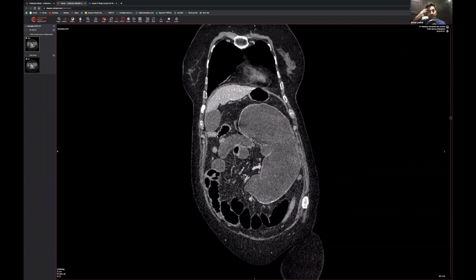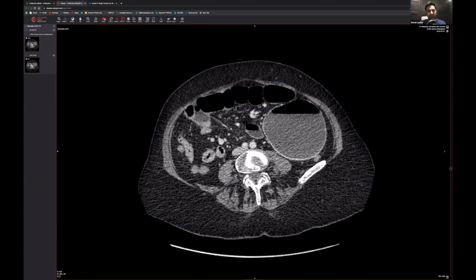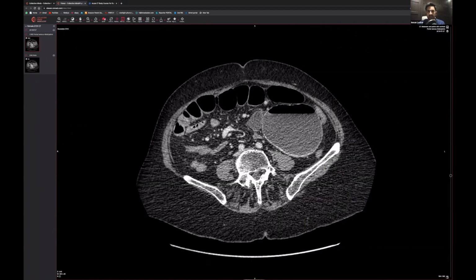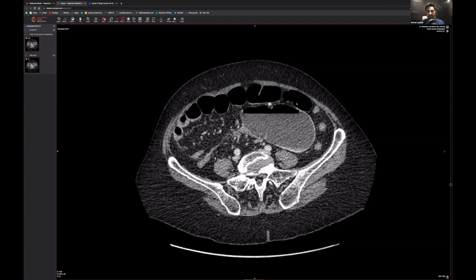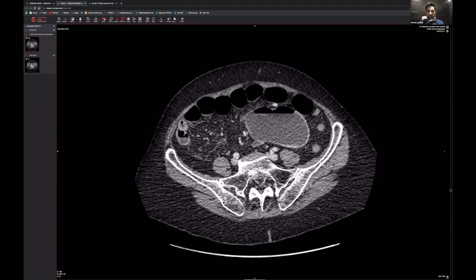Then you've got to think, okay, next thing to think about, is there a perforation? Is there ischemia? Now, you may say, look, there's no ischemia and there's no perforation. But have you noticed how hyper-enhancing that cecal pole is compared to everywhere else? Look at that compared to that bowel, that bowel there, that bowel there.